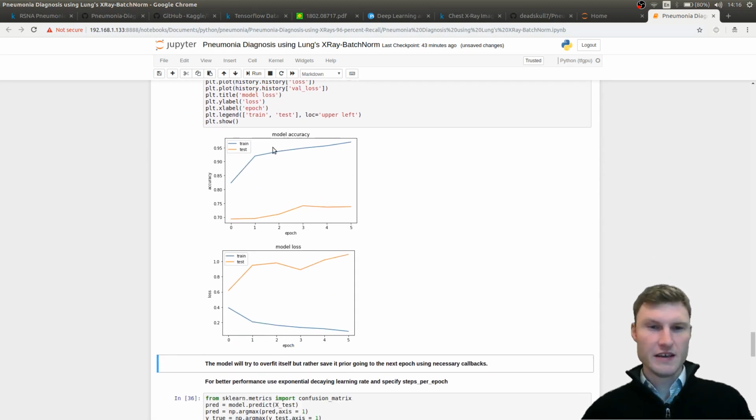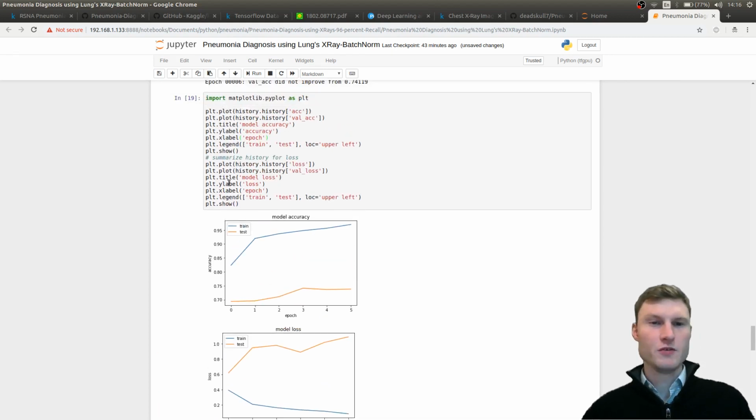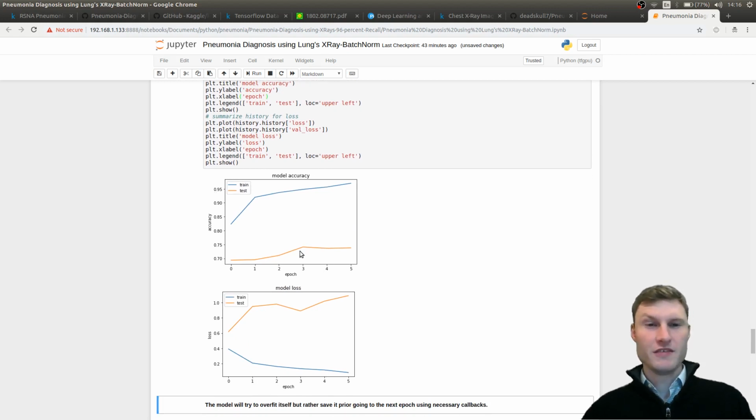Of course, as the epochs advance, the accuracy on the training set goes very high, as an indication of overfitting. But with the validation accuracy on the test set, the accuracy doesn't improve after the 4th epoch, because Python counting starts with 0.